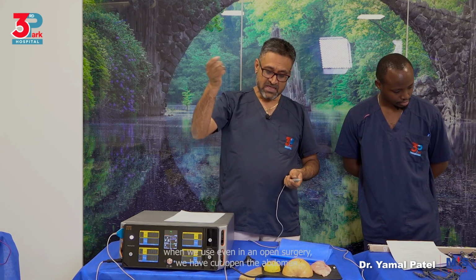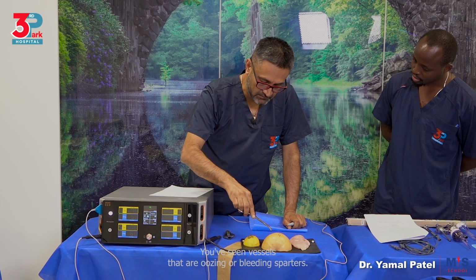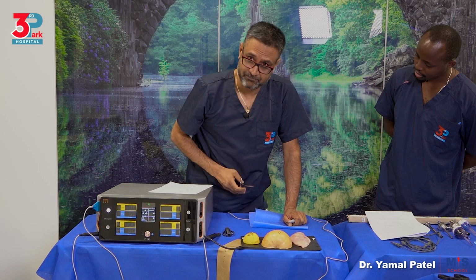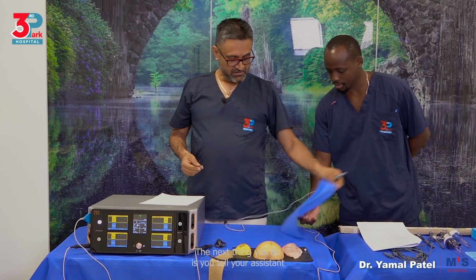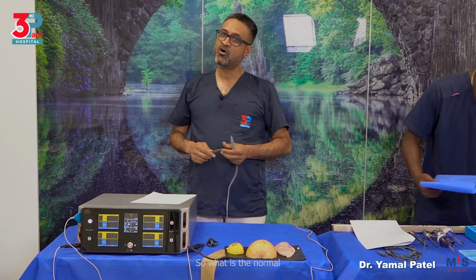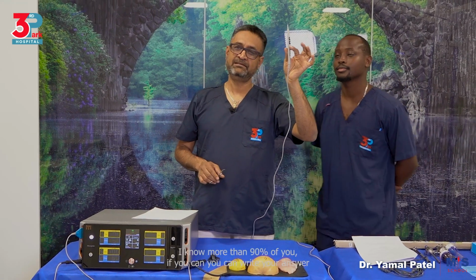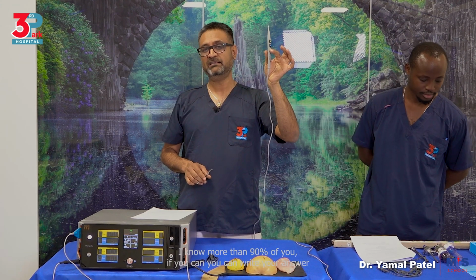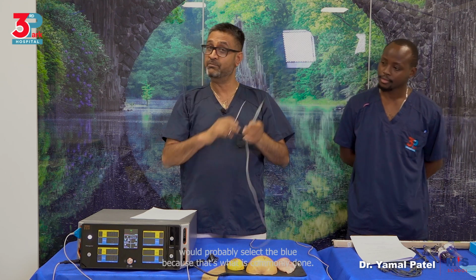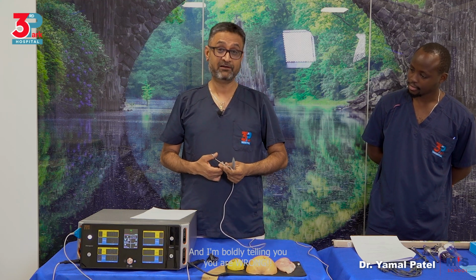Second thing is a very practical scenario that we all work with. Even in an open surgery, we have cut open the abdomen. You've seen vessels that are oozing or bleeding, spurters. You take arteries or hemostats and you hold them. The next thing you do is tell your assistant to go and buzz these vessels. So what is the normal mode that we would all use? If you can, write your answer in the comment box, but I know 90% of you would probably select the blue because that's what is commonly done. And I'm boldly telling you, you are wrong.